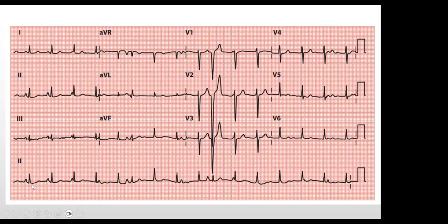So let's assume that this patient's P wave represents impulses from the SA node in the atrium, and then you see the QRS complex. Then you see another one that appears to have a short PR interval, almost close to the QRS complex. And here you don't see anything, but you can see a deflection coming after the QRS complex which looks like a P wave.